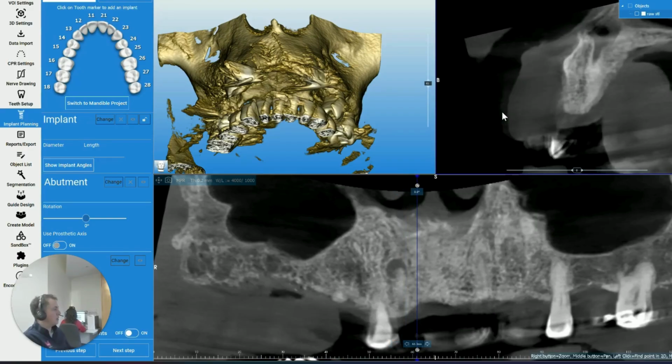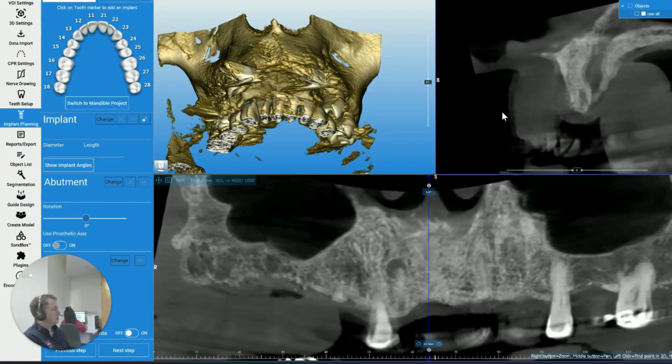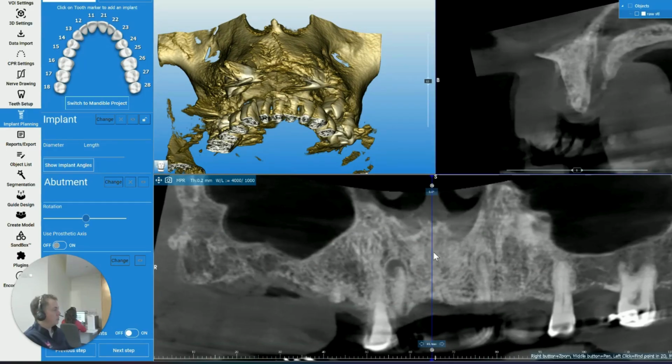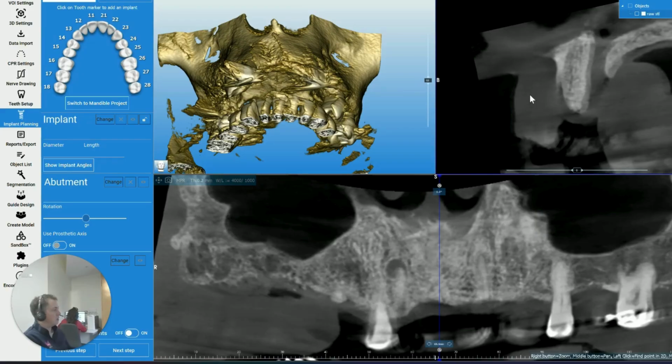We're now getting to this upper right central site. We're going to now see that bit there. This bit between these two orange lines is the start of this ridge here. As we move further on through, you can see this bit there. Now we're getting to around about there. So this ridge is now distorted, or this image which has been stitched together is now overlapped.